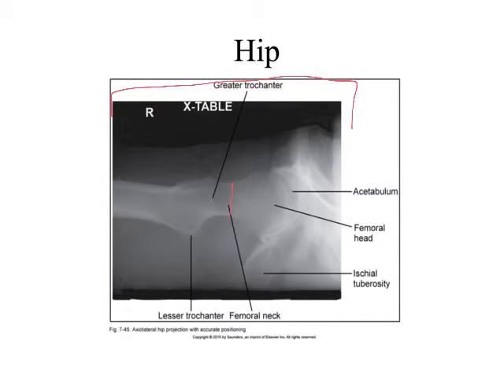And it's also, as a consequence, a higher contrast image, right? The whites are really white right in here, and the blacks are really black right in here, right? There is less grayscale. There's less shades of grayscale here, right?